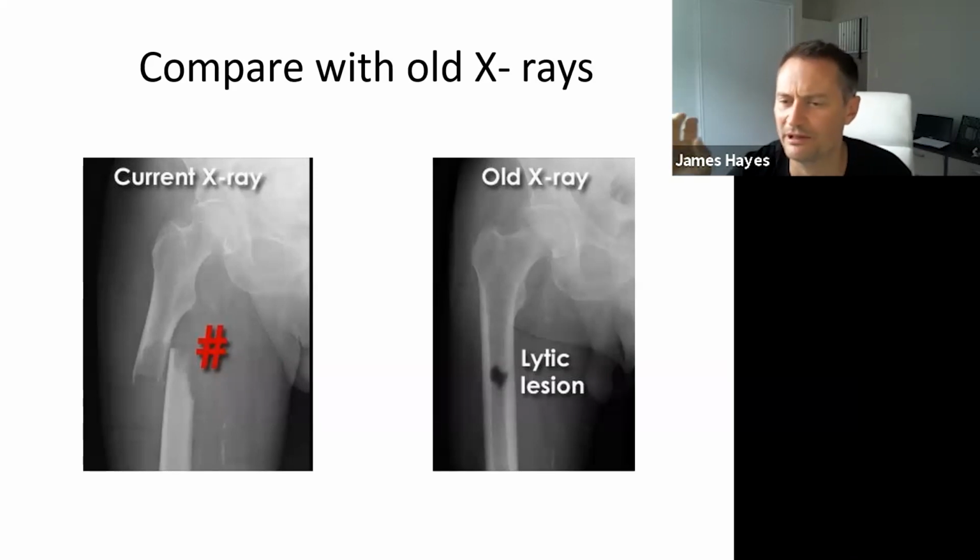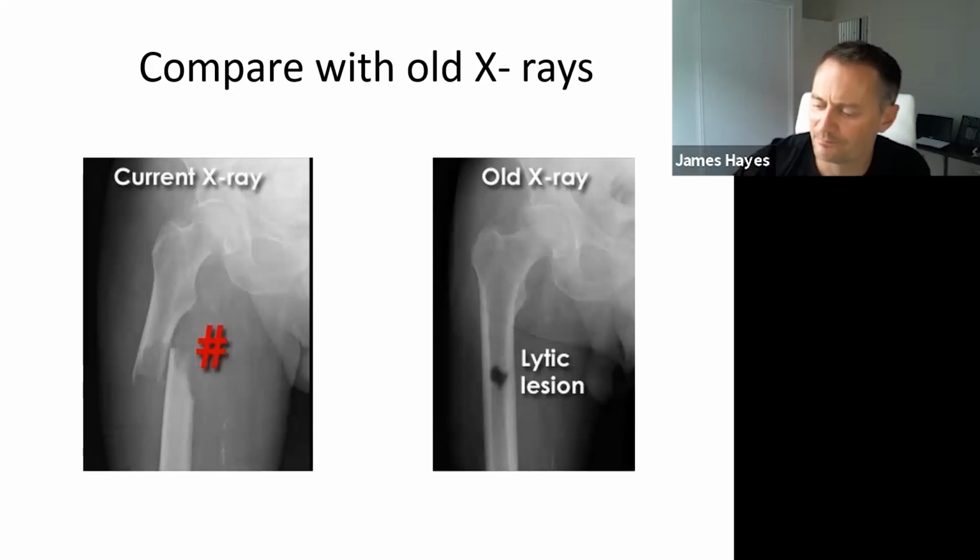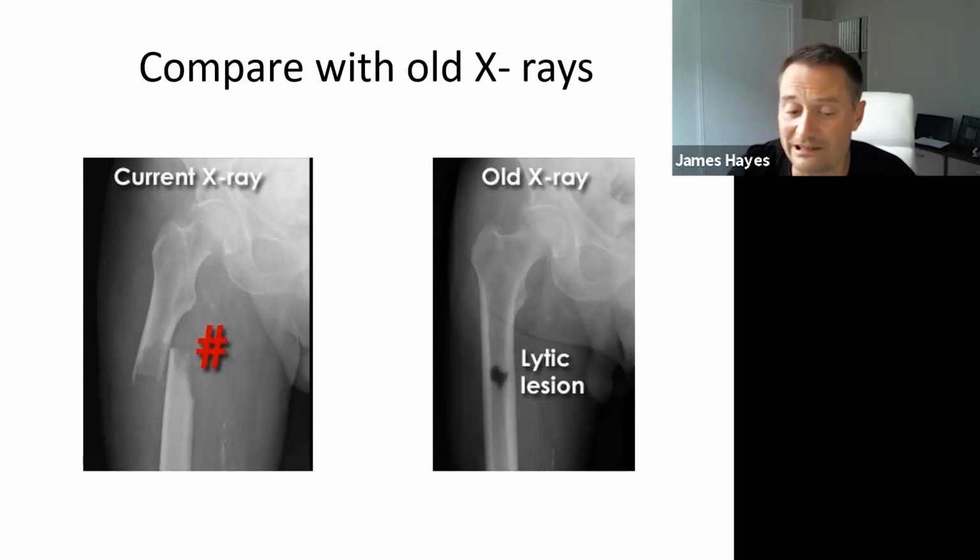And if you see this beak sign, it's got to be brought to the attention of someone else, someone who was foolish enough not to come to this talk tonight. Because in many hospitals, and there's one that is reasonably famous called the Mayo Clinic, with any visible signs of this beak, which is the new bone growth from osteoporosis treatment, they are putting in a bilateral femoral rod. Now that is huge, it is a huge operation.